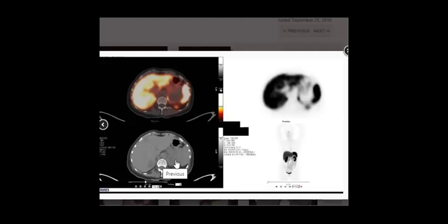So bilateral suprarenal masses, spleen, and yes. And if you go to the uptake, you will find that there is high uptake involving the liver and spleen. But as we discussed before, maybe the liver uptake is physiological, it's high.